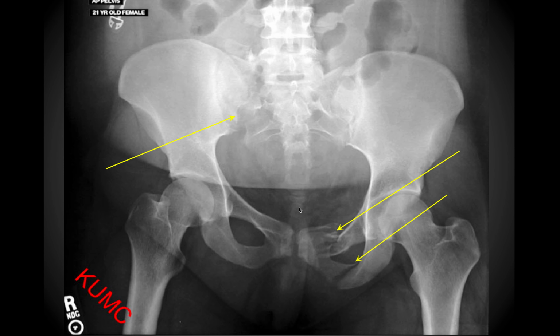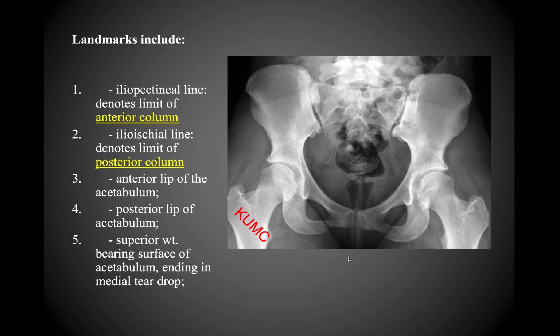And once again, you'll notice that there's this clear asymmetry from left to right along the pelvic brim in this patient. So again, just by simply looking at the rim of the pelvis, or the pubic bone around the pelvic inlet, and then around each of the obturator foramina, it makes it relatively easy to identify these very significant fractures in this patient.